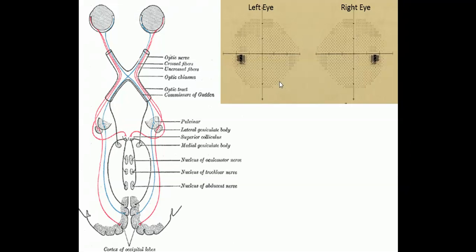And what I like to think about it, at least in these 24-2 fields, is you can think that this is where the nose would be, and that's why it has this shape. Of course, that's not really why it's like that, but it just helps to remind ourselves that.